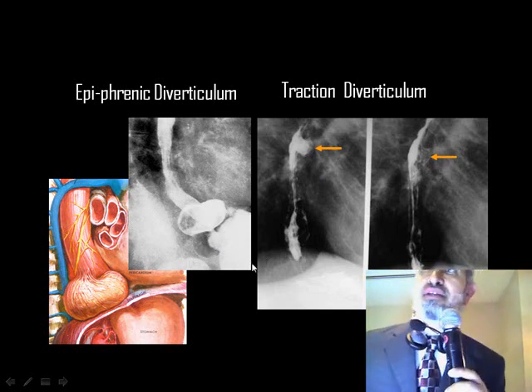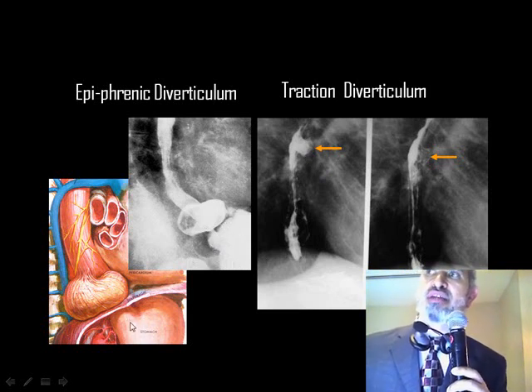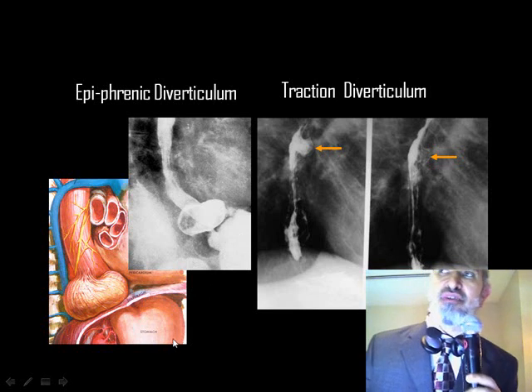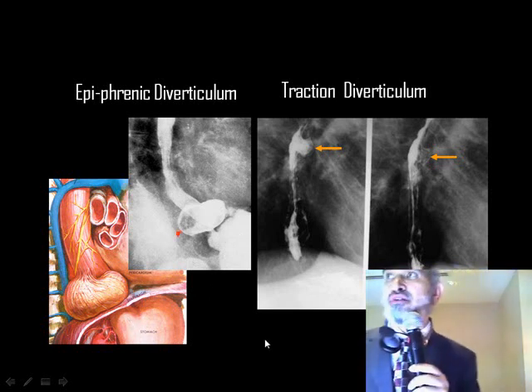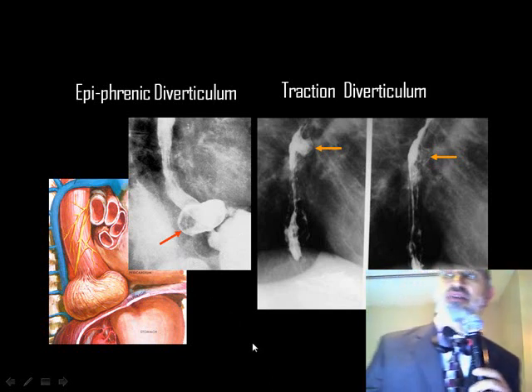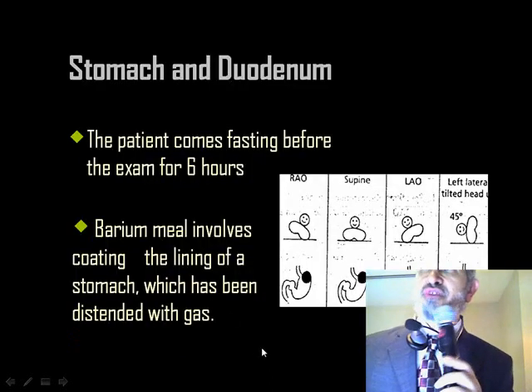can easily discriminate between this diverticulum and the hiatus hernia if you can see that the whole stomach is under the diaphragm, as well as the gastroesophageal junction is also under the diaphragm. This is the rarest type of esophageal diverticuli.